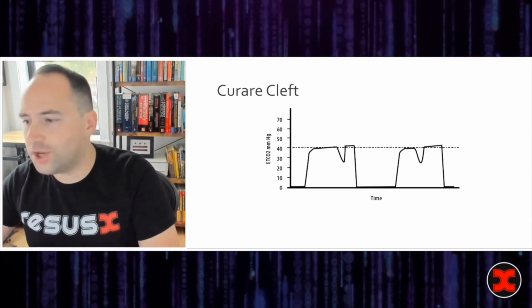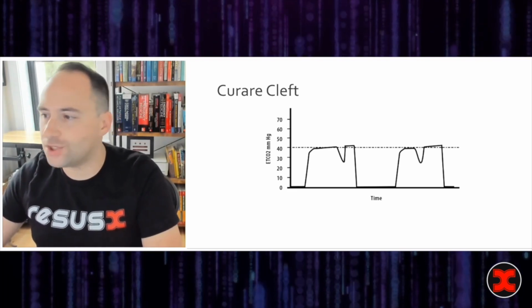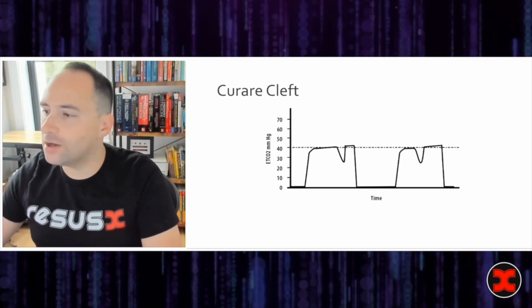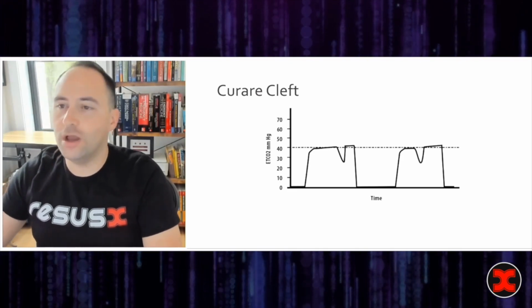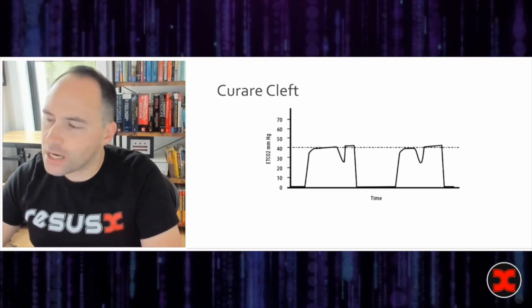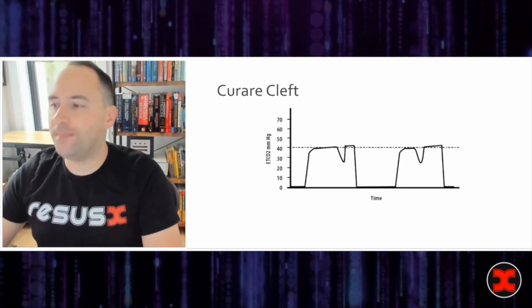All right, this is called the Curare cleft. What you can see here is that somebody took a bite out of phase 3, as if they were about to start phase 0, but didn't actually start phase 0. This is because when patients were waking up from anesthesia, that is to say their paralytic was wearing off, they were starting to inhale, but not completely inhaling. So this is to say that the patient needed to be recurarized or reparalyzed.